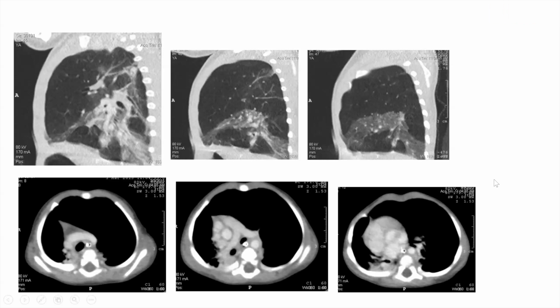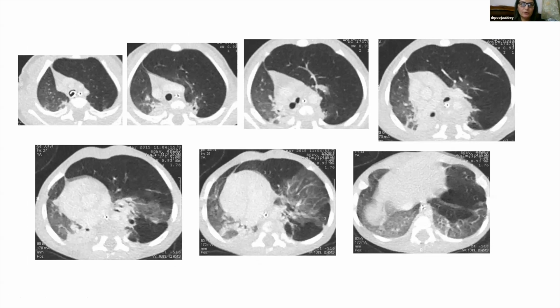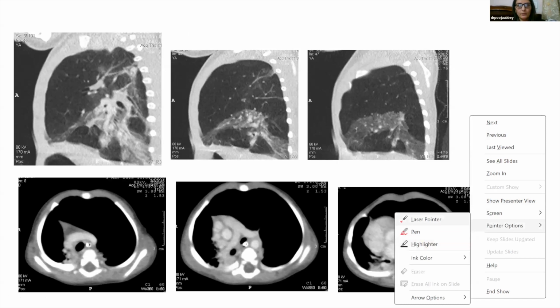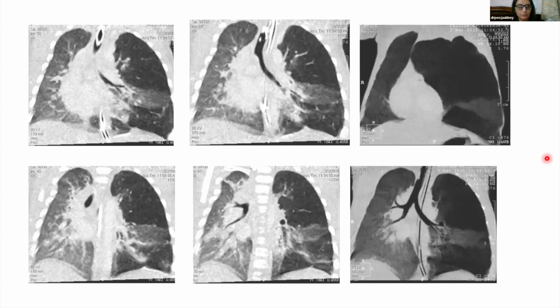Thank you. So basically, I just got this case. Finally, what happened to this child now? Actually, I don't know, because I think initially the child did not really give consent to a repeat surgery. But the point was that these are the initial CT images, the CT that we did before the child was operated. And we looked at this, and by we I mean whoever one of us was reporting it.